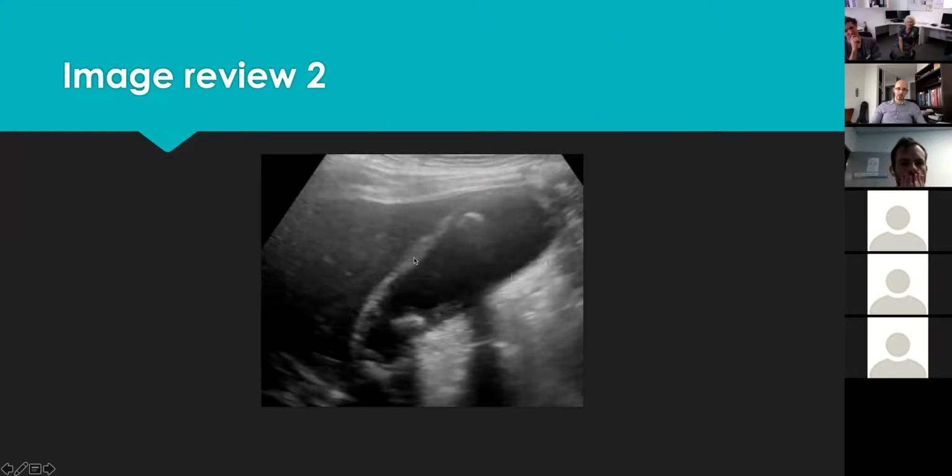Regarding the thickening that you mentioned about here, that's another pitfall. If you imagine the ultrasound beam is coming from there, widening up like that, anything pretty much not perpendicular to the ultrasound beam can be smeared because of the beam width artifact. And that smearing is to the width of the ultrasound beam. Usually at that sort of depth, with most ultrasound transducers, especially if your focus is not there, you're looking at 4 or 5 millimeters of the beam width, something like that. So that's why we usually don't measure it there.